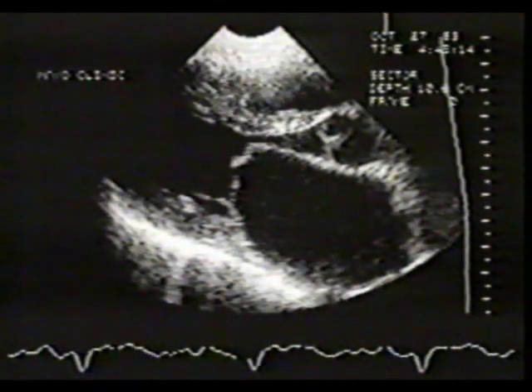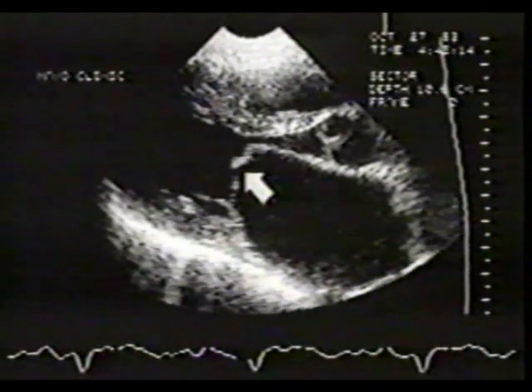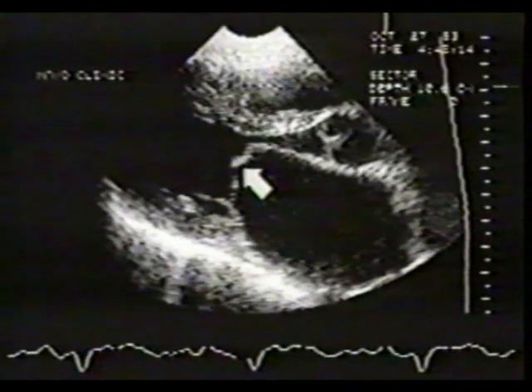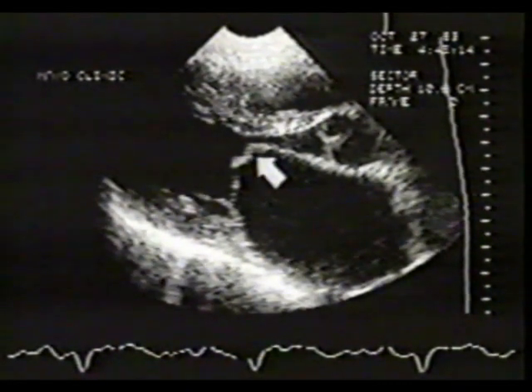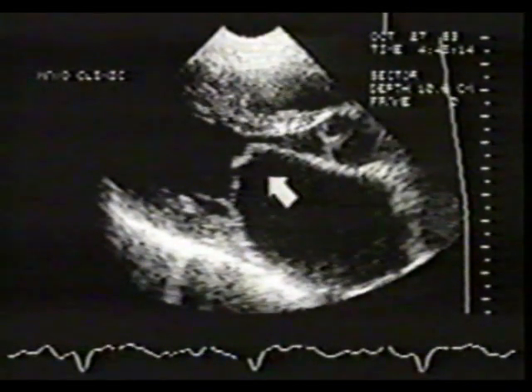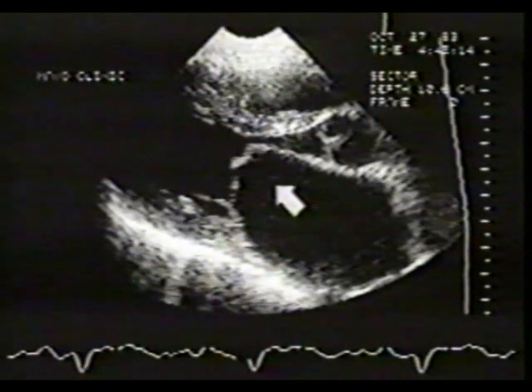In this diastolic frame, the aortic cusps have closed. The mitral leaflets are opened. Note that they are thickened, especially at the closing edges. The diastolic separation is reduced. The leaflets are tethered to one another, but the belly of the anterior leaflet, in this case, is very pliable and has moved toward the ventricular septum. This gives a characteristic hockey stick appearance to the anterior mitral leaflet. In real time, focus your attention on the characteristic motion abnormality of the mitral leaflets.